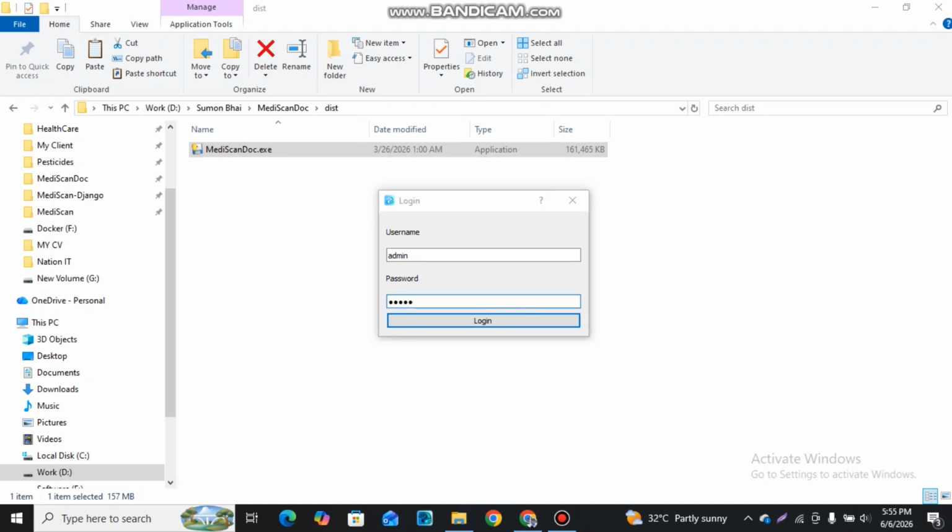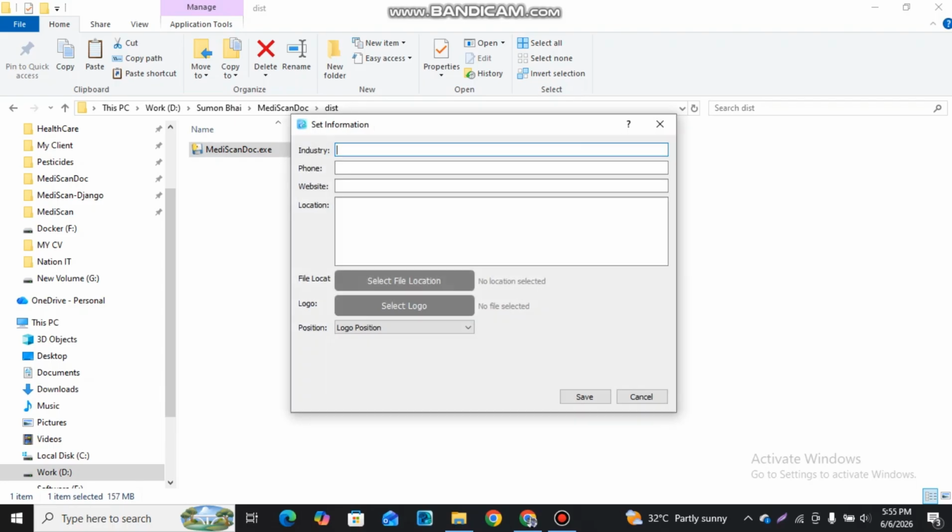So first time I will insert the installation information. So first time I will add information.